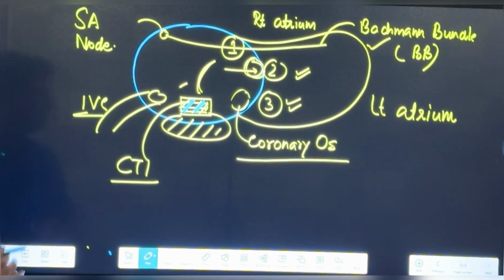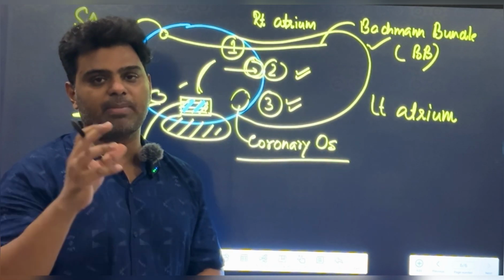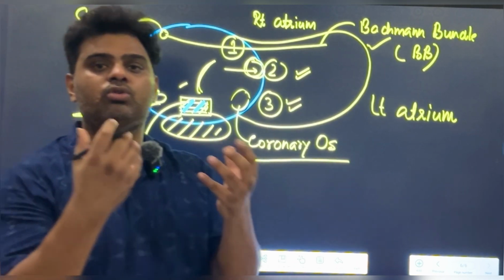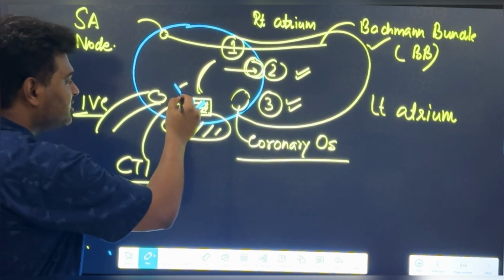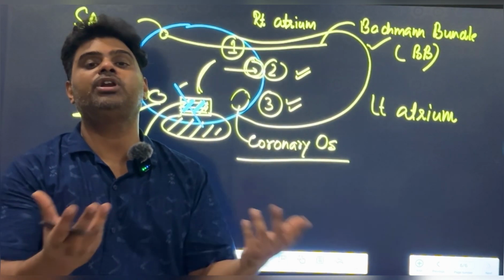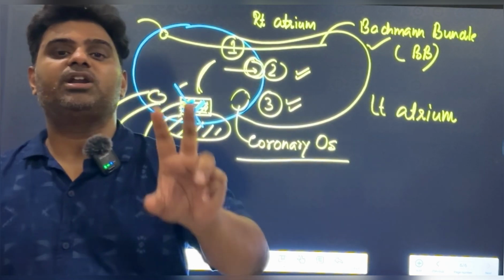So first we will understand that 95% of the atrial flutters are CTI dependent. That means the depolarization, or the microcurrent, will pass through this CTI. So what will help? If we are somehow able to diagnose that this is a CTI dependent atrial flutter, we can simply ablate this CTI. And if we ablate, if we destroy this CTI, then the atrial flutter will automatically be treated. There will be no need for further pharmacological treatment. Therefore, it is very important to understand what a CTI dependent atrial flutter is.